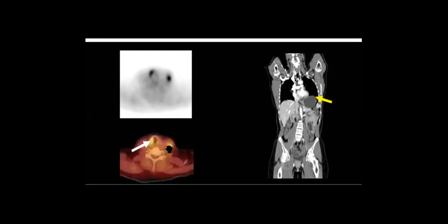It looked like with high uptake, do you agree? And maybe the appearance in the CT is not very nice, so it looked abnormal, right? So is it really in the right vocal cord? Do you agree that it's in the vocal cord? There is some high uptake here.